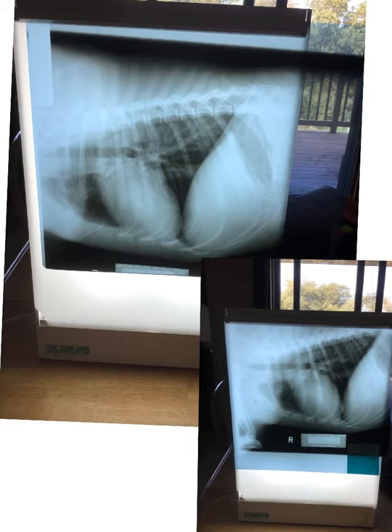So this x-ray here that we're comparing is a lateral thorax that we're also looking at for positioning. And for this one, the top x-ray is actually missing its cranial landmark. So I cannot see that point of the shoulder, which means that there's a whole aspect here in the cranial lung fields, this very cranial aspect that I can't see. This thorax actually continues up and off of our screen.